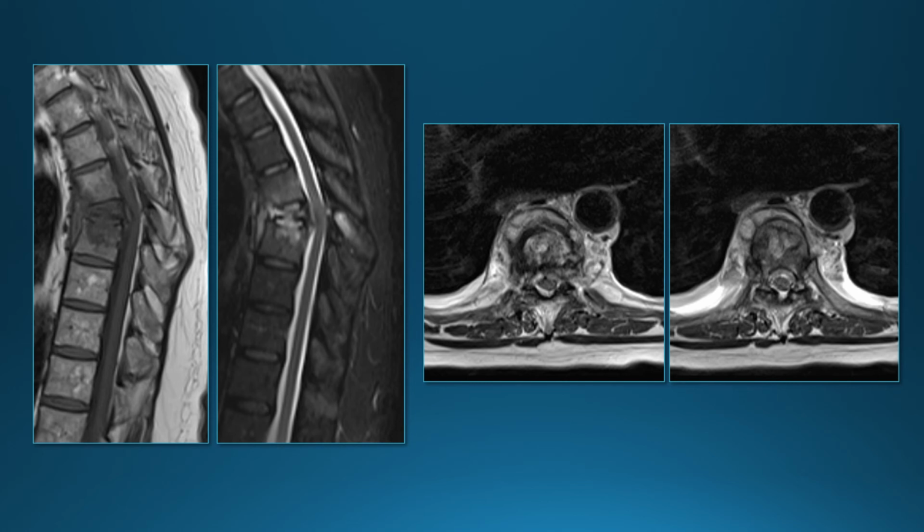This is a patient with atypical mycobacterial infection. Tuberculosis and atypical mycobacterial infection look pretty much the same. Marked vertebral collapse, so-called gibbous deformity here. And you can see that the disc, although the signal in the disc is a little bit abnormal, the disc space is pretty well preserved here. So considering how much vertebral involvement there is, the disc is still pretty good. We can see some prevertebral soft tissue thickening, and we can see it nicely on the axials, as well as the epidural soft tissue mass.